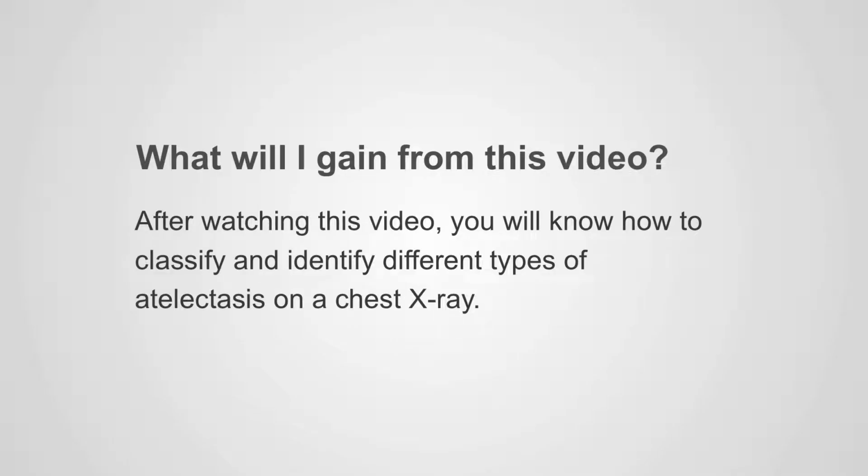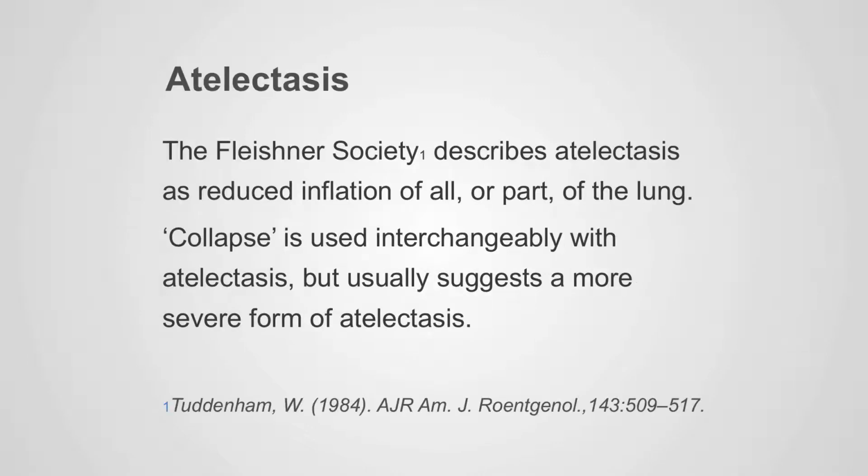What will I gain from this video? After watching this video, you will know how to classify and identify different types of atelectasis on a chest x-ray.